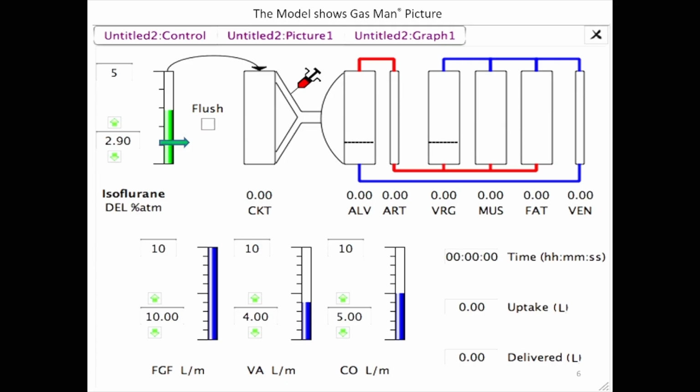And from the lung, if you look at this black line, the alveolar black line, that suggests the MAC value of the agent. Sevo will be at 2%. ISO will be at 1%. And this black line in the vascular rich group, meaning the brain. Ideally we should achieve the concentration in the brain. So this will show 2% concentration as a black line, as the MAC value is 2. Same way, this is the MAC value.